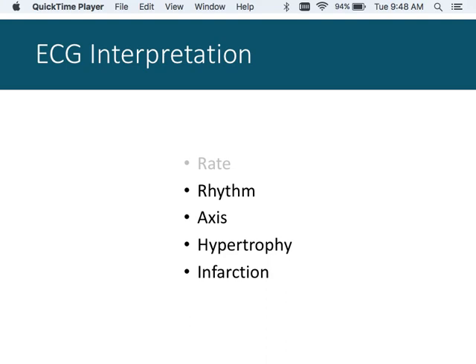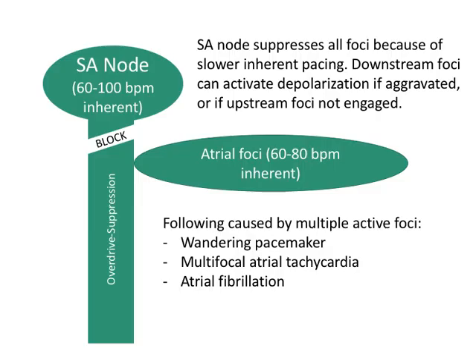Excellent. Each one of the large boxes, starting from a QRS complex that overlays one of the major grid lines, counting successively. Or you can measure them, or if you have the ticks at the top of the ECG trace, you're lucky to have that paper, then you can ballpark it with the 6-second rule. But rhythm, no problem. Or sorry, rate, no problem.